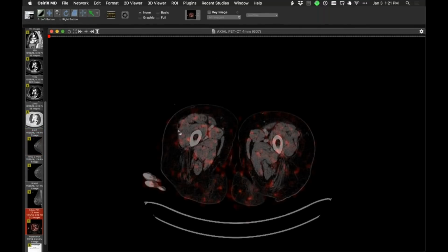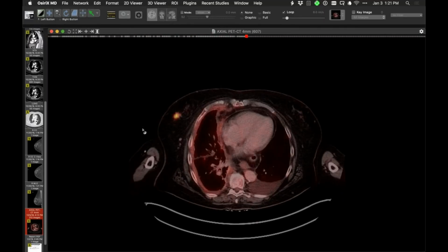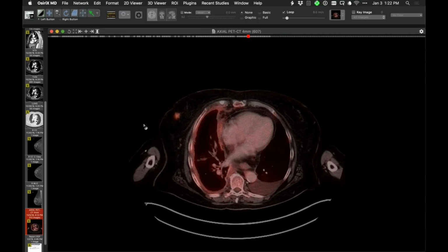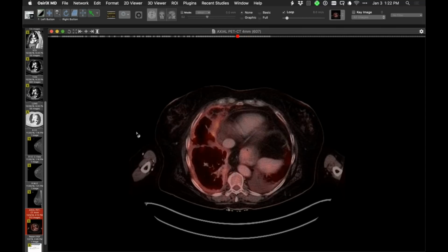And as you'd anticipate, the PET shows all of those findings. A very extensive pleural membrane disease shows the breast cancer. So this is presentation of metastatic disease from a relatively small breast cancer, a very extensive pleural disease. So I always teach my residents, examine the pleural surfaces really carefully. And if there's no ready explanation for the pleural fluid, suggest malignancy, mesothelioma, or metastatic malignancy from elsewhere.